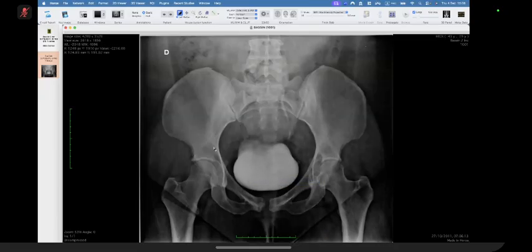What do you think of this one? Hip pain. I've been presented with a frontal radiograph of a pelvis of a skeletally mature patient. I can see multiple lytic areas involving the pubic rami bilaterally. Also, some lytic areas involving the left femoral shaft, neck, and head. Bilateral hip joints are otherwise unremarkable. I cannot appreciate any gross abnormality in the iliac crests or the iliac wings. I cannot appreciate any fracture line. The visible vertebrae, transverse processes, and the visualized part of the sacrum appear unremarkable.